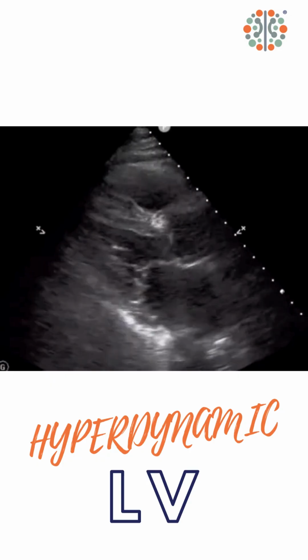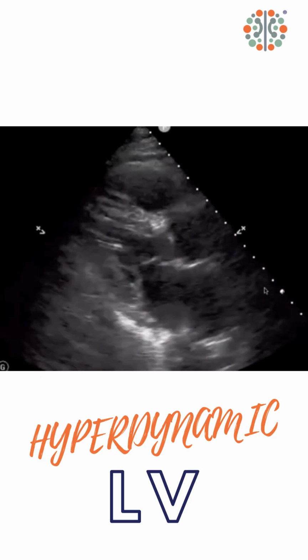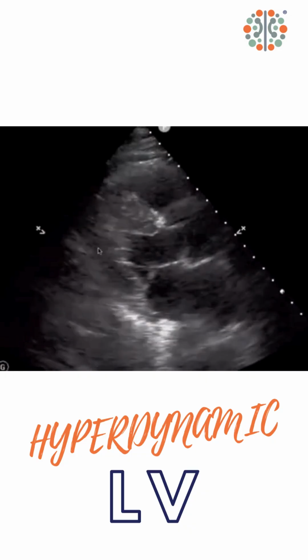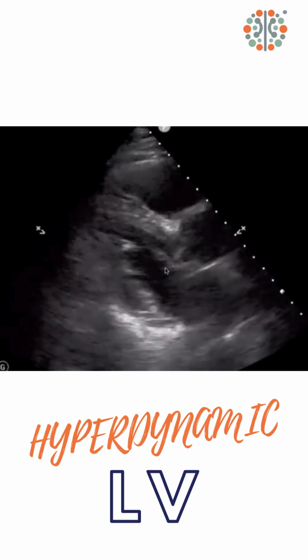Coming close to the septum is normal, as I previously discussed. Slapping up against it, as seen here, is not. This finding is not specific to intravascular volume depletion or one specific diagnosis, but would require further investigation into this pathology.